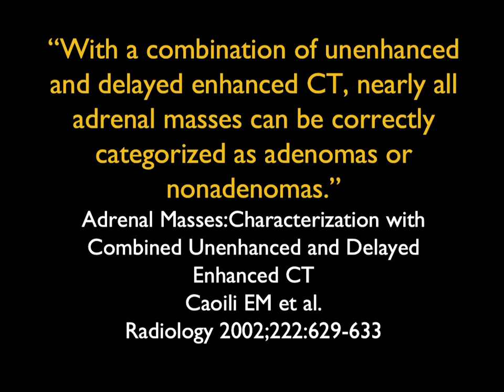Remember, on the non-contrast scan under 10, you can stop if it's under 4 cm as an adenoma. But what if it's 30? What if it's 40? It could be many things. But once you do the washout, if it goes from 40 to 100 and then goes back under 60, it's an adenoma. Okay, so it's something to look at.